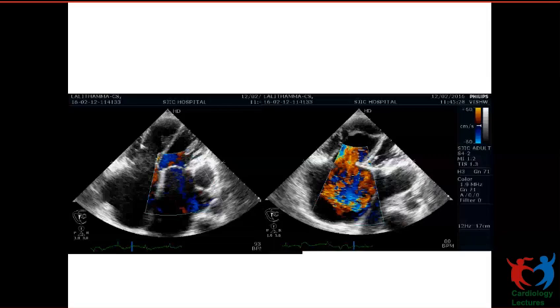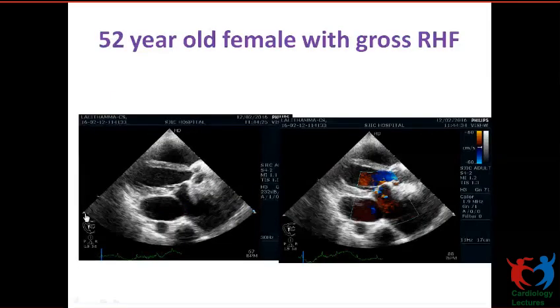That is behind, no? This is the aorta. So we are talking about this structure. Differential diagnosis could be dilated coronary sinus, or sometimes submitral aneurysm, or LV aneurysm.